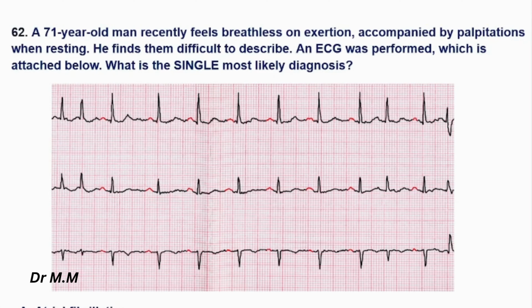Here we are going to talk about another question of cardiology. A 71-year-old man recently feels breathless on exertion, accompanied by palpitations when resting. He finds them difficult to describe. An ECG was performed, which is attached below. What is the single most likely diagnosis?